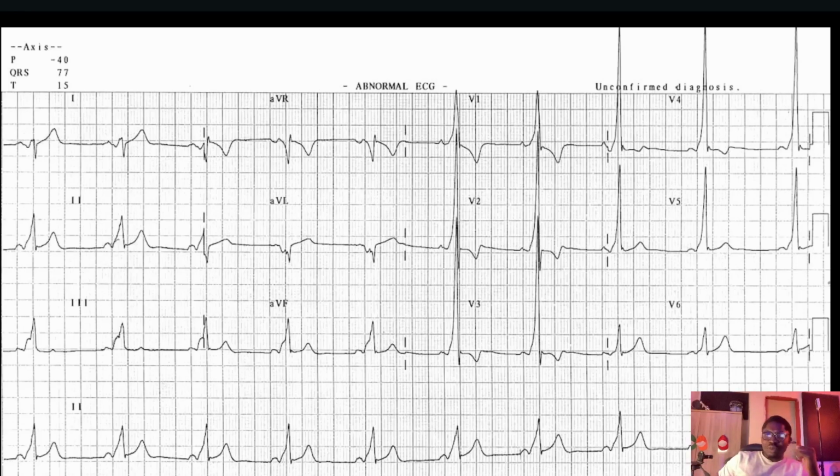If you tuned into my last video, I looked at pericardial effusion. Very interesting case, or very interesting ECG. I think this is equally as interesting.